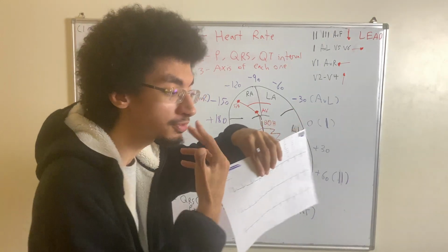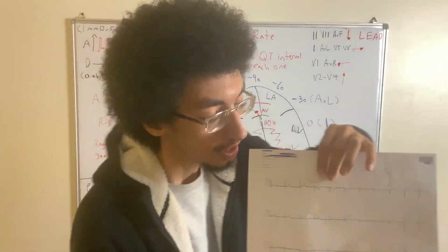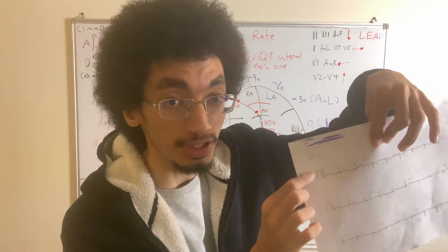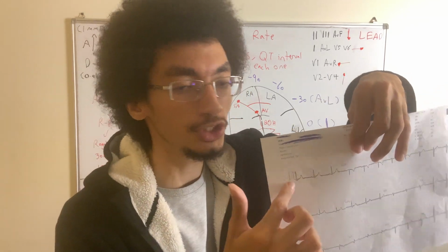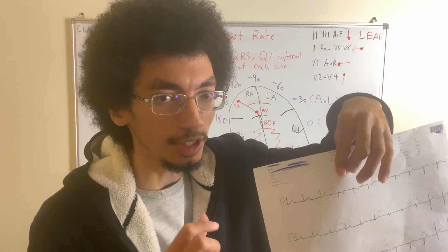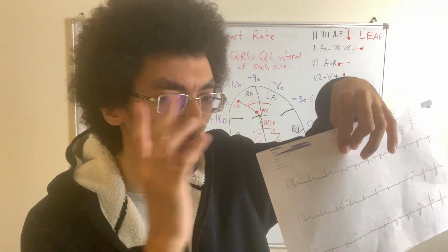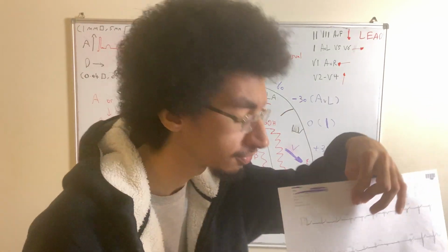That's important when it comes to calculating the heart rate. Otherwise, a lot of the other leads, when they show the rhythm tracing starting from this drawing right here, will show it within a 2.5 second duration. So you'll see lead 2 for around 2.5 seconds, this one for 2.5 seconds, this one for 1 second, for example.